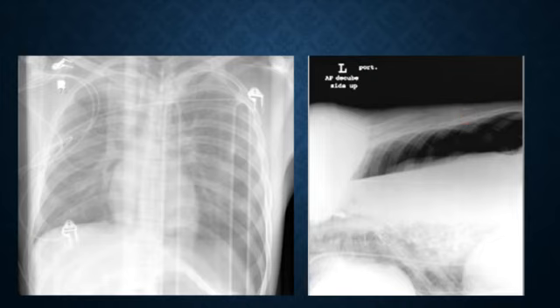Again, another example. Very ill patient, you can see multiple ECG leads on the chest, indicating he's in a critical condition. There is increased lung opacity, and compare this sulcus with this. This is much deeper and relatively much more well defined compared to the right side. So when you do a lateral decubitus view, you just turn the patient laterally and take a lateral view, you can obviously see the air will be up and you can easily see the pneumothorax.